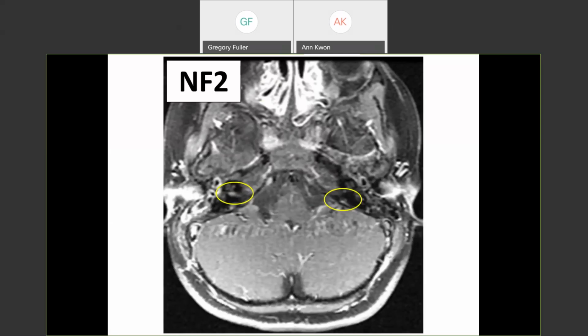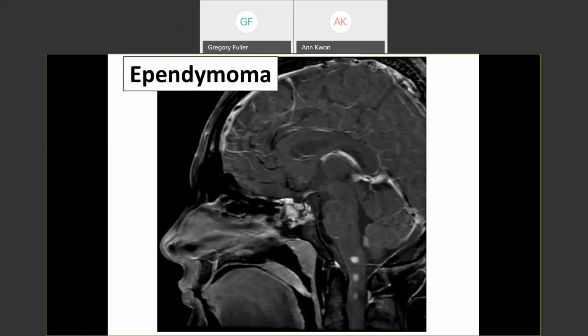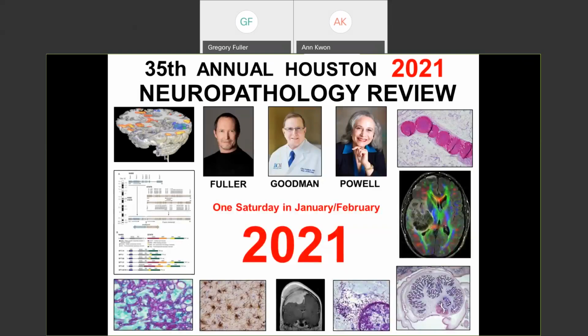Again, this is the smallest that you will see, but they are diagnosed, even unexpected, unilateral, sporadic, intracanalicular ones, all the time by expert neuroradiologists, those with a good eye. Okay, there we go. And of course, the diagnosis here is ependymoma, maybe multiple ependymomas, but that's what it's going to be.